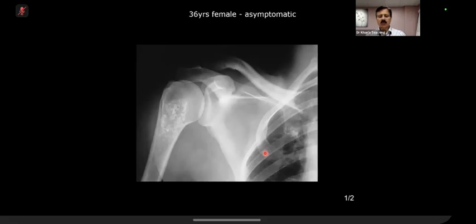Spot diagnosis, what is your diagnosis? It looks like an enchondroma of the right proximal humerus. Right, so enchondroma. Now, if you can make a note of what I am going to teach you right now, if you've got a pen and pencil, these are take-home points.